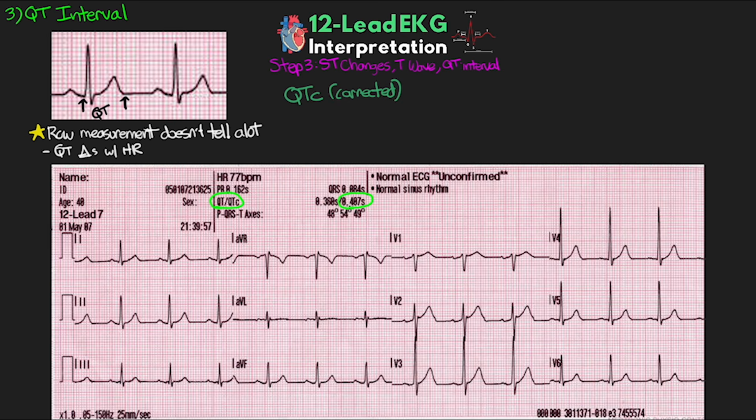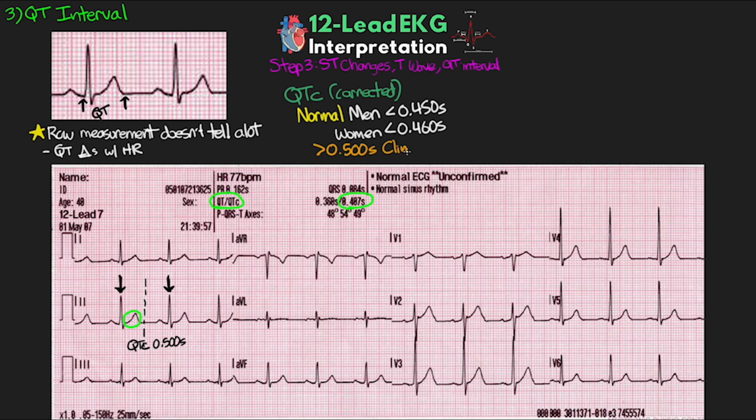One quick rule of thumb when we're evaluating our patient's QT is to take 2 consecutive R waves and then find the halfway point between them. The halfway point is going to be a QT corrected or QTC of 500 milliseconds. The preceding T wave should conclude before this halfway point. So a normal QTC for men is actually considered to be less than 450 milliseconds and less than 460 milliseconds for women. That said, generally greater than 500 milliseconds is really when many consider this to be clinically significant, and thus our general eyeball rule of thumb is good for evaluating this.